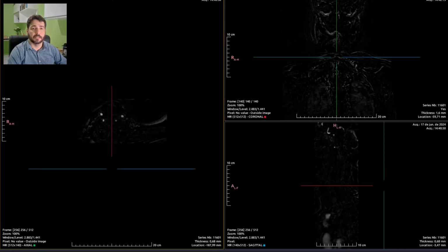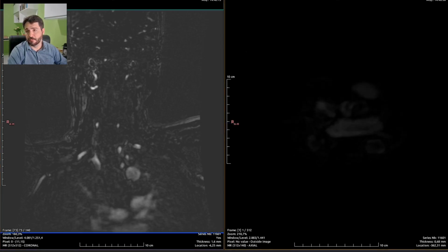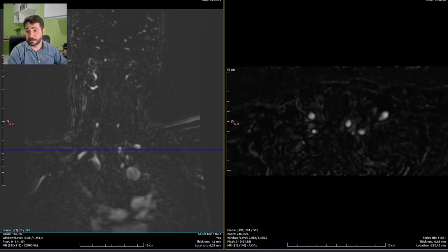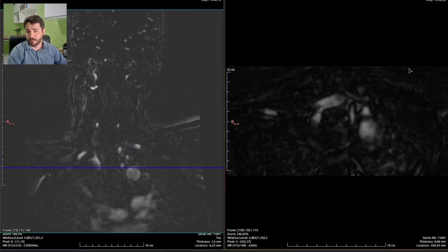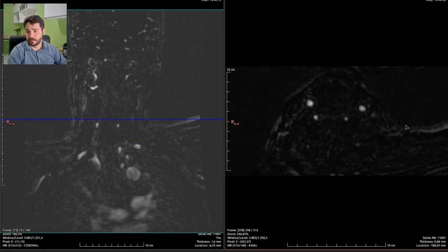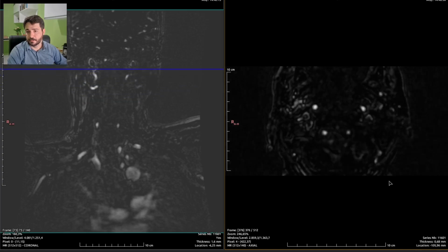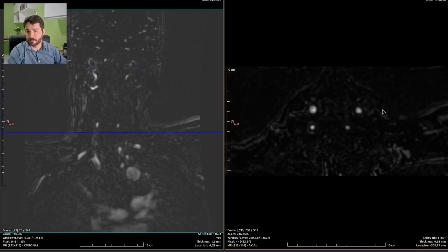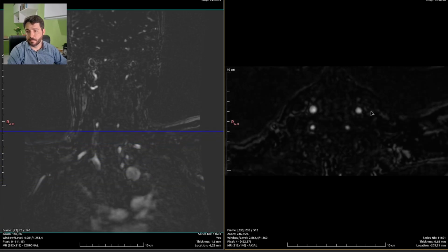Let's hit an MPR button and look for disease on the best plane of all, which is the axial plane. Real men read axial images, children do MPR. So we are children, we are men.